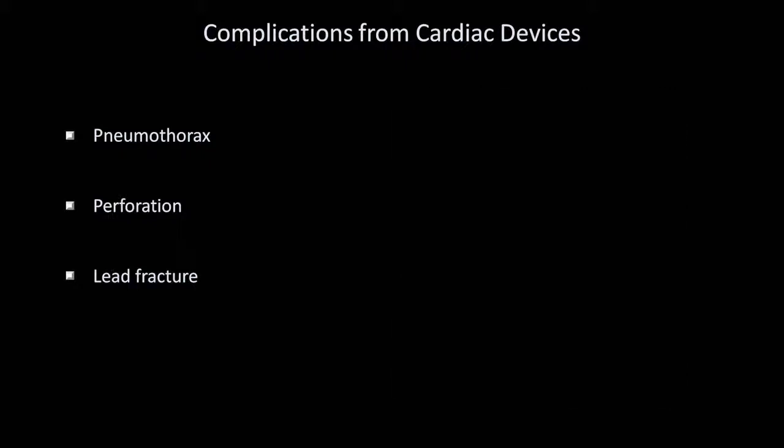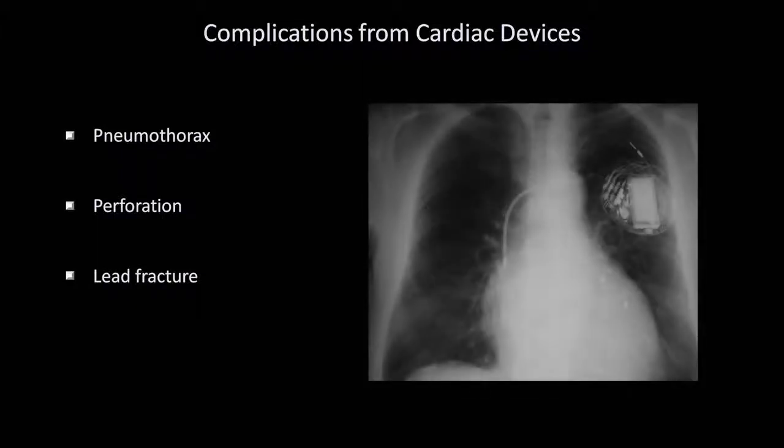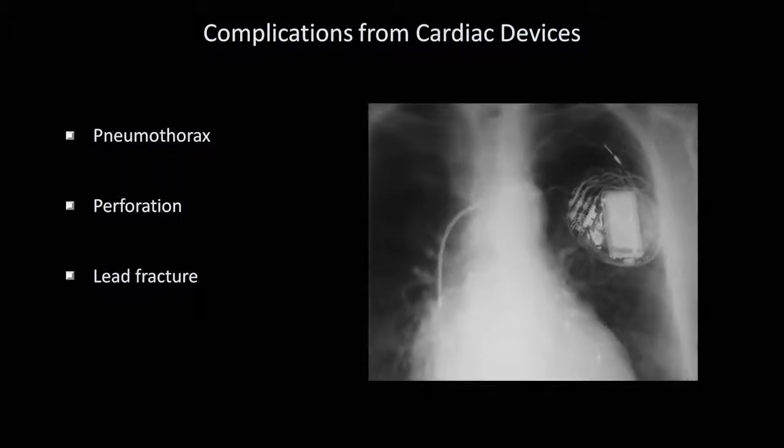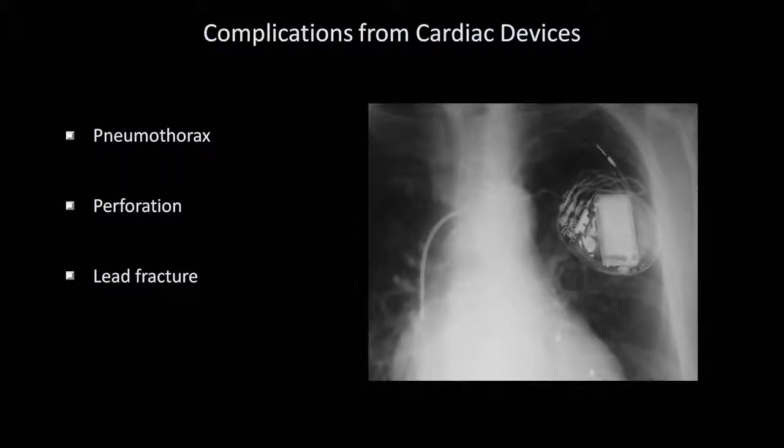The last complication is probably more interesting than it is common and is demonstrated here. If you look closely in the region of the generator, you may notice that the end of one of the leads, the right atrial lead in this case, has been pulled way back.